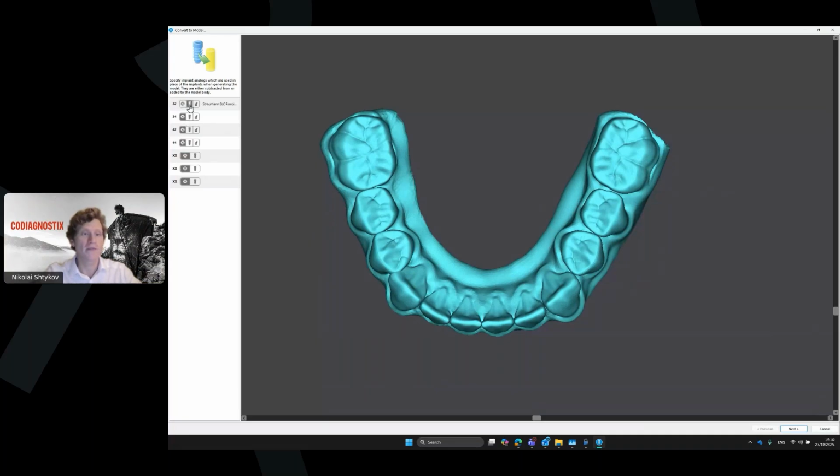And if I look at the implant selection, my implants are there, installed with different angles. But I have screw-retained abutments in this case. That's why I will select abutment level here. And you see that I have some presets. I designed some presets for SRA abutments to have a small hole, or I can create a new preset.